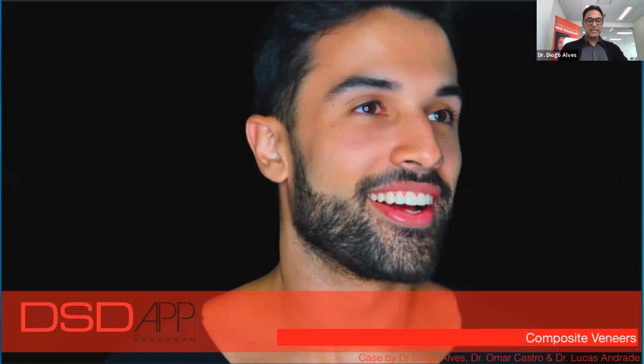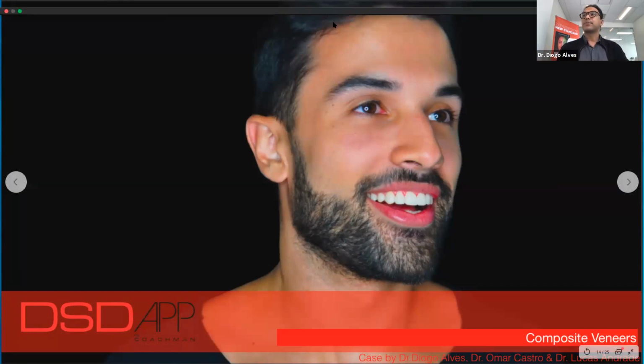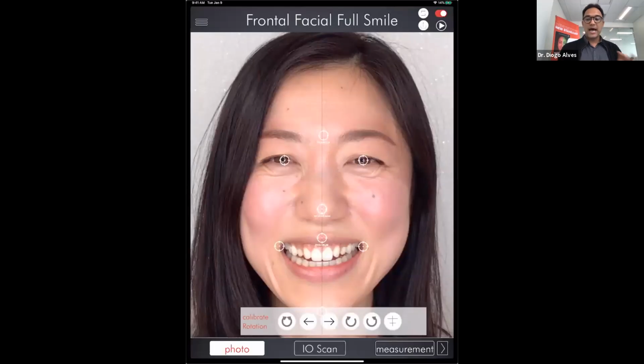Okay. Let me show you guys here in the app an example of how you can design the composite veneers guide yourself. On the app, all you need is one photo, correct, Dr. Diogo? Just this one frontal photo, and you can begin doing that smile design. Yeah, for the motivational smile simulation, all you need is one frontal facial picture.